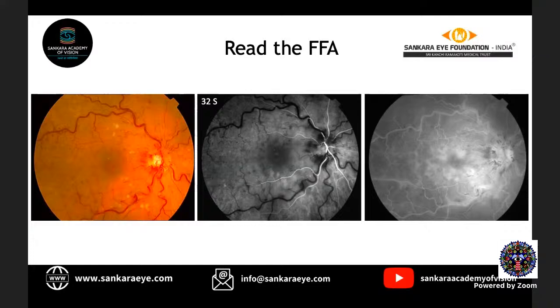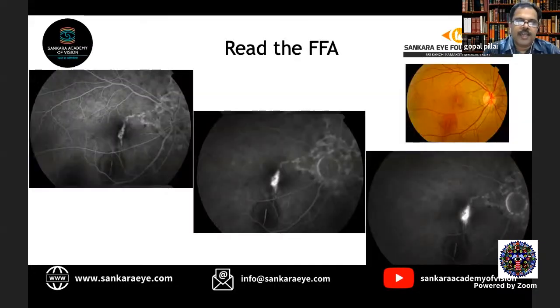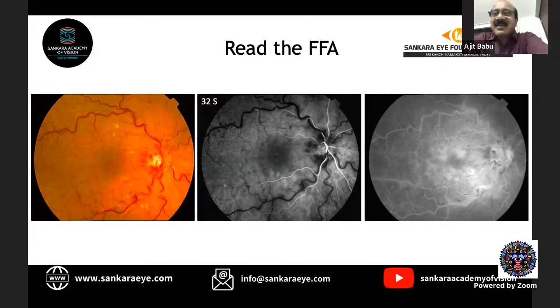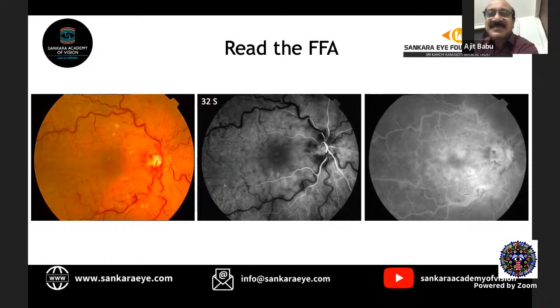So there is a delay. We need to know whether it is just a delayed arterial filling, or a delayed arteriovenous filling also. There is a definite delay in the venous filling. Yes, I would like to clarify one thing.